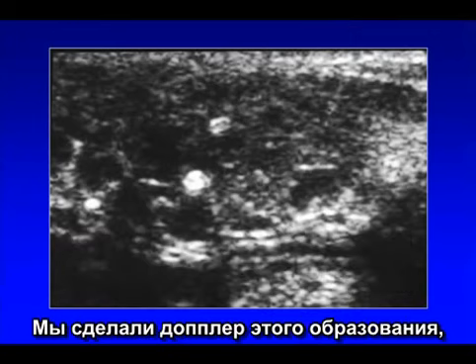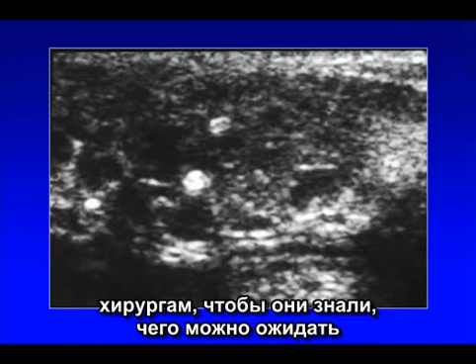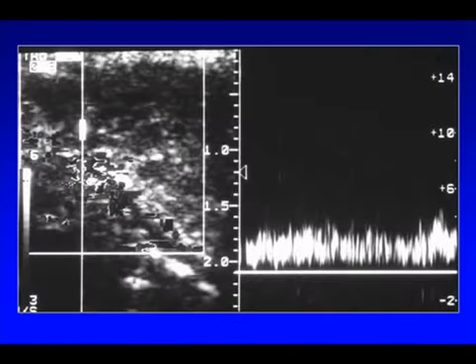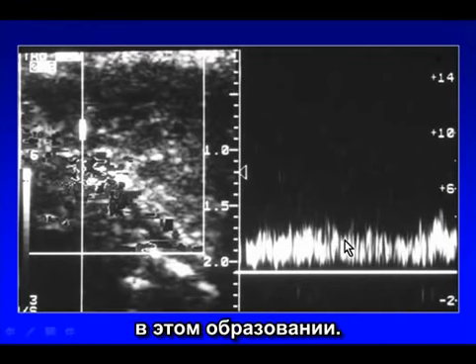When we actually did a Doppler of this lesion, we found no arterial flow, only venous flow. So this was characteristic of a venous malformation, and that gives an added extra bit of information to the surgeon to know what they're going to be expecting when they go in to treat this lesion. And here is the Doppler of that flow showing just a venous waveform. No arterial flow was detectable throughout this lesion.